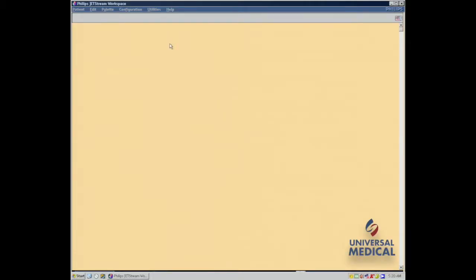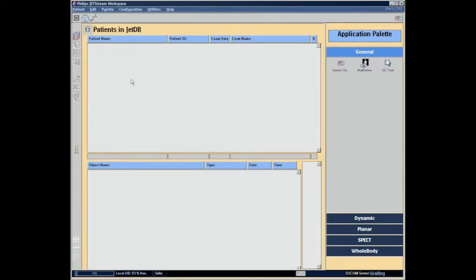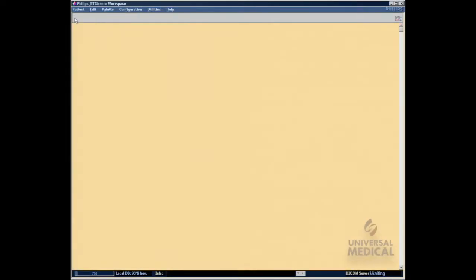In this video, we are going to restore patients from a patient CD. I'm going to be restoring example patients so that we make sure we don't have any kind of HIPAA violations. If we look at our system right now on the main workspace, we don't see any patients. If I open the patient browser, we have no patients. This system is completely void of any patients. So what we're going to do is we're going to import some patients from that CD.